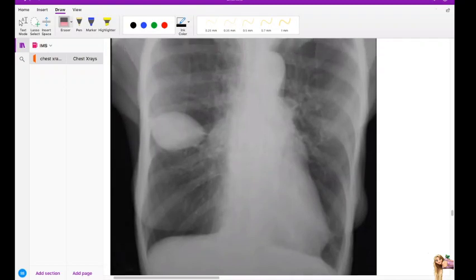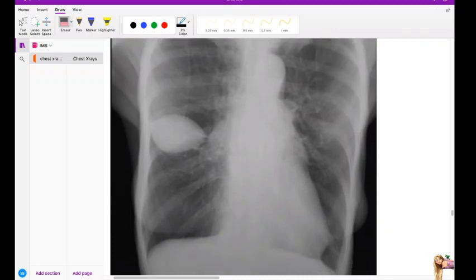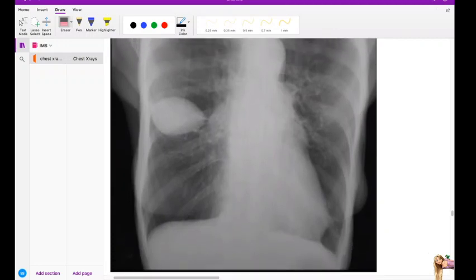And then we'll stop. What is this X-ray, guys? TB. Okay, what else? It also looks like a tumor. This is called the phantom tumor sign. Basically it looks like a tumor, there's some consolidation kind of a thing, but it is actually just a pleural effusion within.